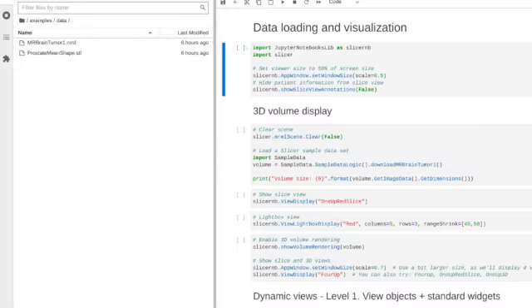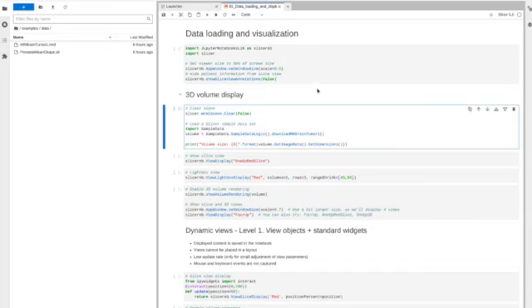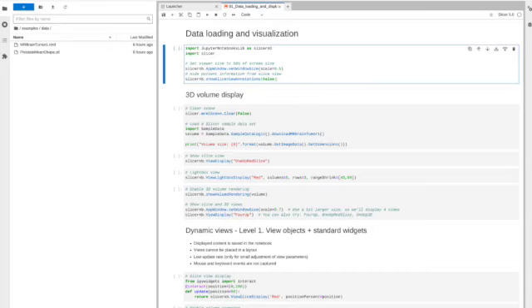So it's actually collecting them all into one file called an NRRD file. And so I'm just going to go through some cells. By the way, if you're not used to using Jupyter, it goes through the code run in a code cell, but then you can also add additional cells.